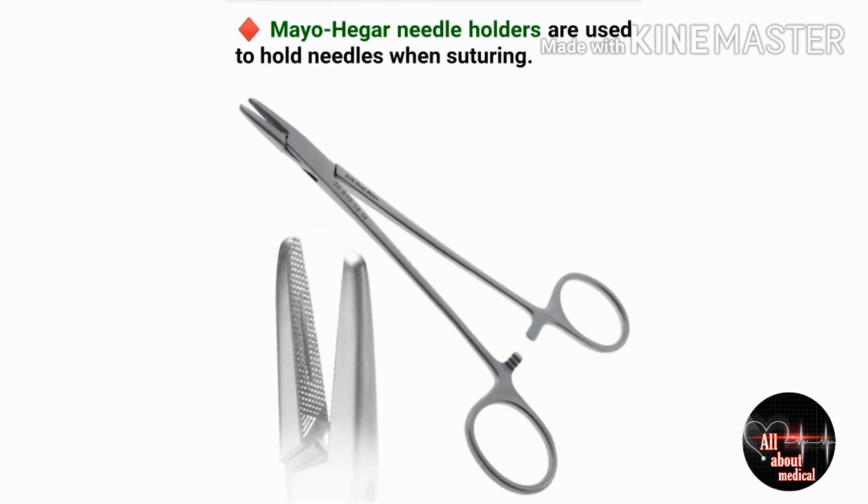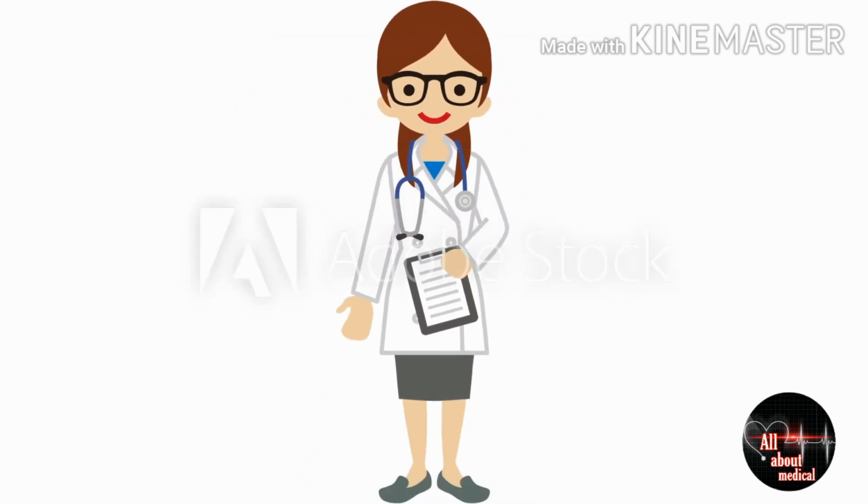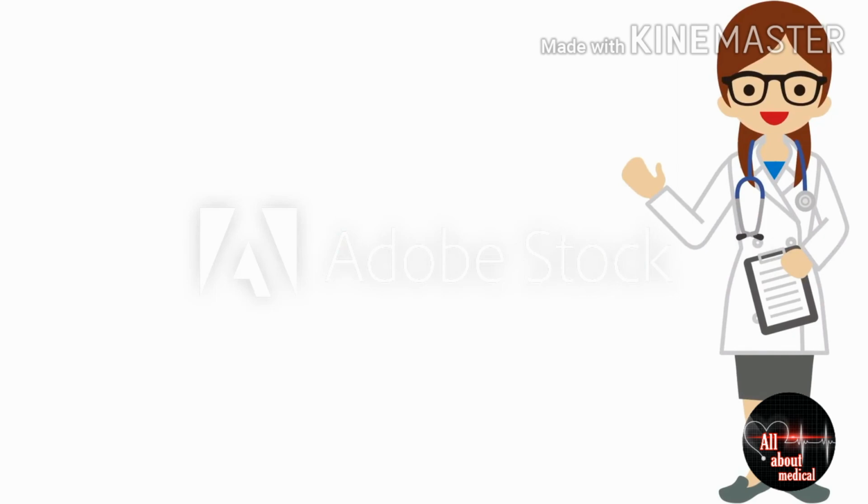Now can you appreciate this beautiful instrument image? This is the Mayo-Hegar needle holder. Yes, it is the Mayo-Hegar needle holder, which is used to hold needles when suturing. So friends, this was all about our third category of surgical instruments.